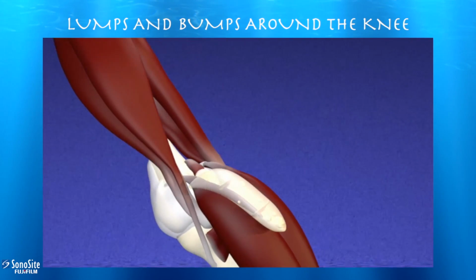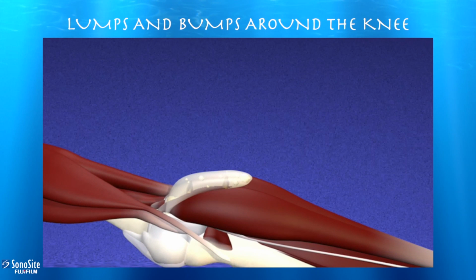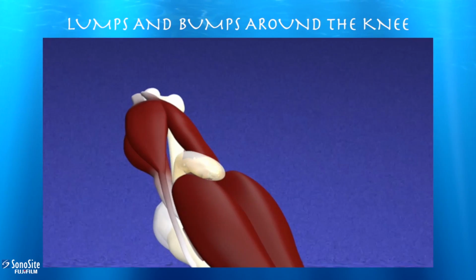Baker's cyst you can see above the medial gastrocnemius muscle, and within this Baker's cyst you can see some loose bodies and septi. Here on a sagittal perspective you can see how it just lies superficial to the medial gastrocnemius muscle, making it a relatively safe bursa to aspirate.